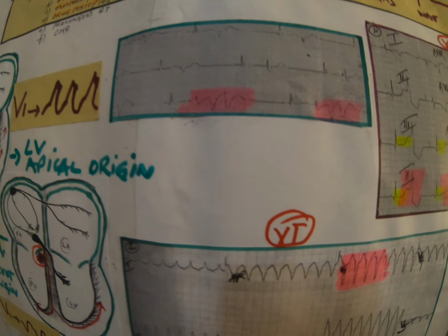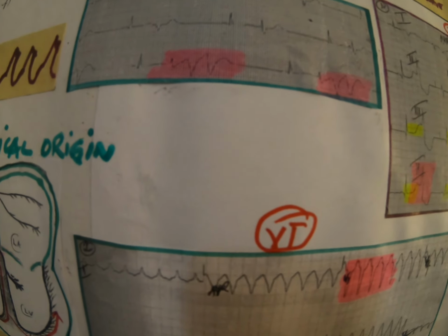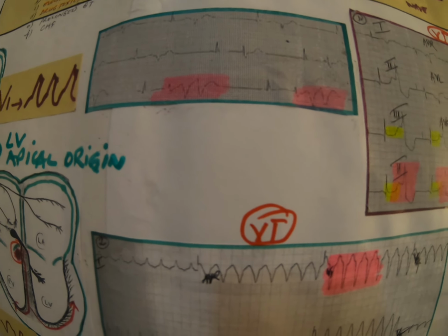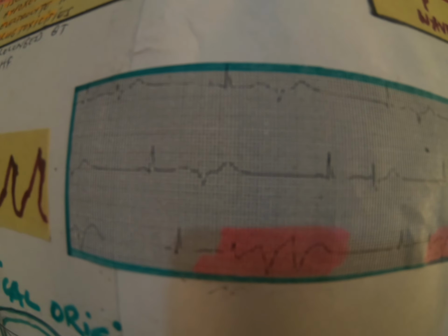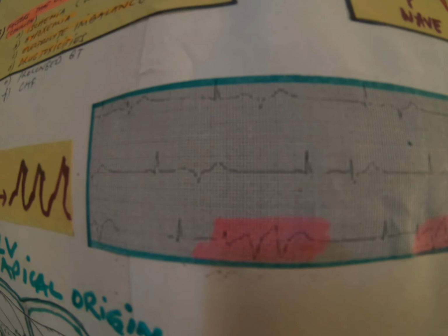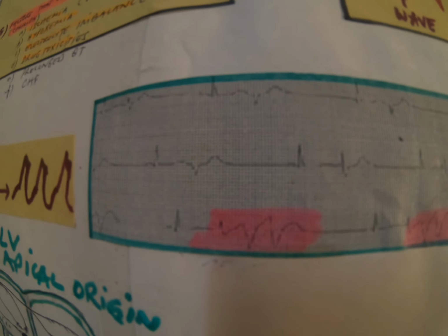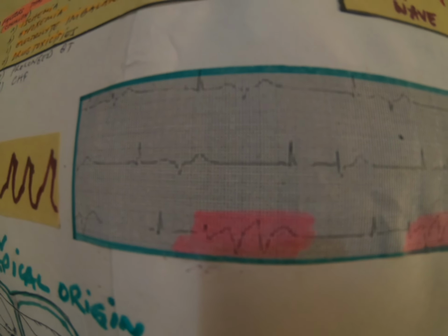Examples here of strips. I got references, but I tried my best to get whatever I could, just to give you some visuals for my discussion here. So we see that in this strip here, you got 2 ventricular beats. So keep an eye, as I said, start checking your labs, check your patients.